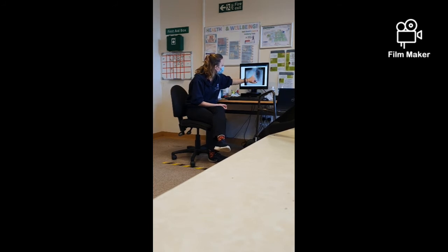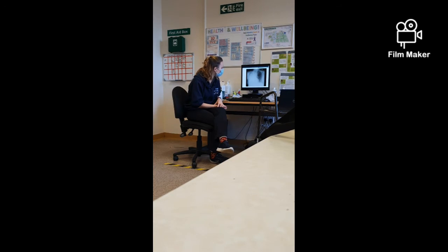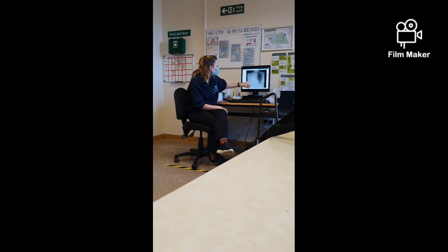We were thinking about the bones, if there were any fractures, weren't we? So with the bones, the best way is to follow the bones round, and you'll be able to see if there are any fractures or not. What we can't do is follow them round on the left, we can't see them properly. Would you say the X-ray's underexposed? Potentially yes, a little underexposed. You can't see the spinous processes all the way down. You can't see them through the heart. So yeah, a little bit underexposed, and that might be a reason why we can't see all the ribs. But also it can be affected by what's going on on this right hand side.